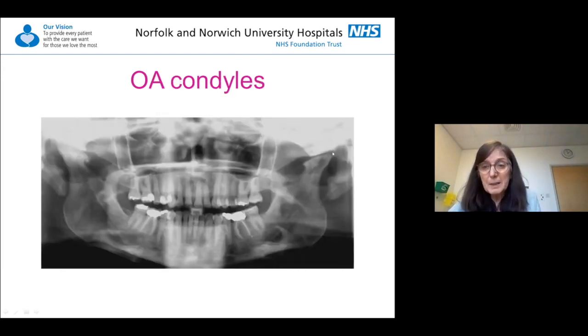So temporomandibular joints and ENT sometimes cross over. You see patients with earache who've got pain from their temporomandibular joints, and we see the occasional patient thought to have TMJ pain who's really got earache. So there's a bit of a two-way flow of patients. But you can see on this OPT this classic appearance of osteoarthritis: lipping of the condyle anteriorly, osteophyte formation, loss of joint space, and flattening. The temporomandibular joint should be a nice rounded joint, but actually this is really very flattened.